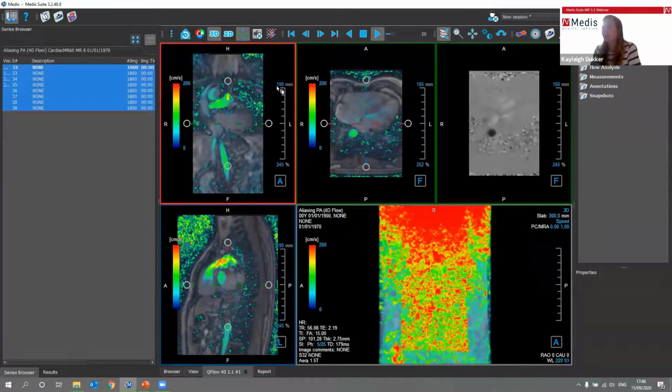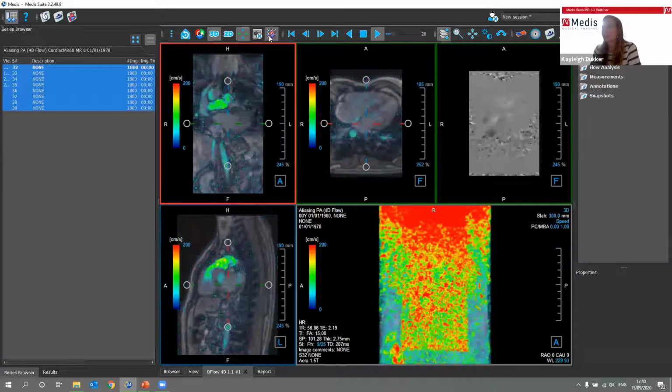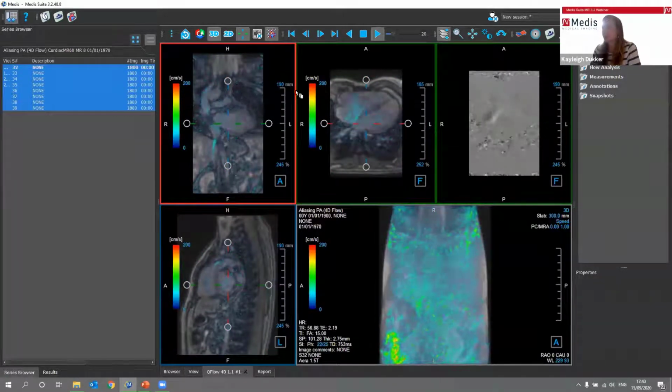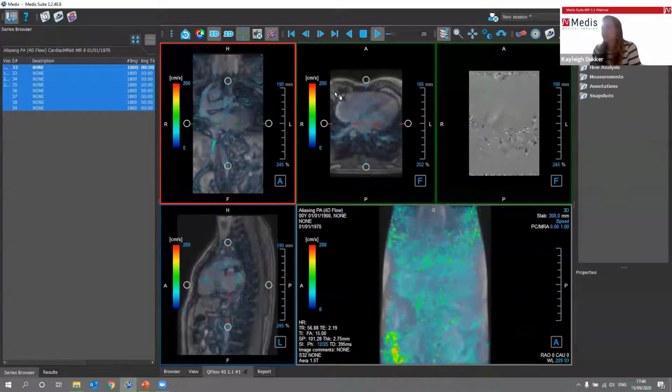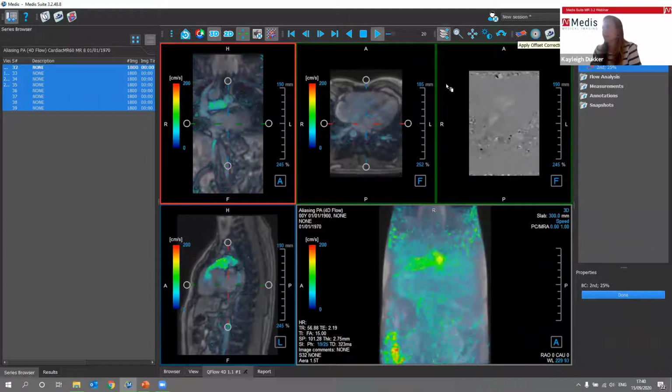I can feel already that I'm also broadcasting it, that it's a bit slower on my system, but I think still a good speed overall. So let's do the background correction and the noise removal.